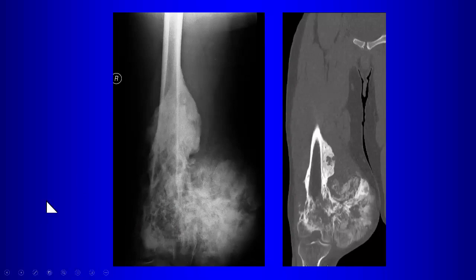So this was a patient with an osteosarcoma. Usually it's not a surprise that the osteosarcoma is established already when we find the nodules. The point is, in somebody with osteosarcoma who has calcified nodules, we can't assume that those nodules are granulomatous disease, right? So with osteosarcoma or chondrosarcomas, calcified nodules can be metastases.